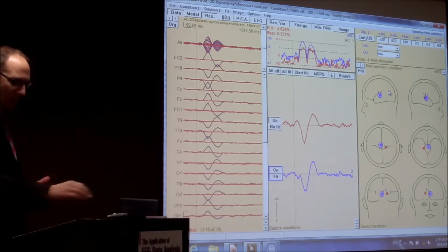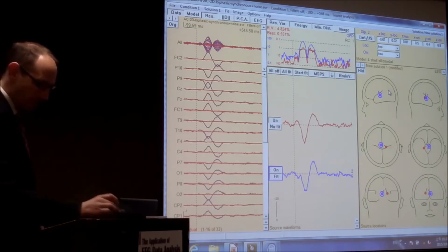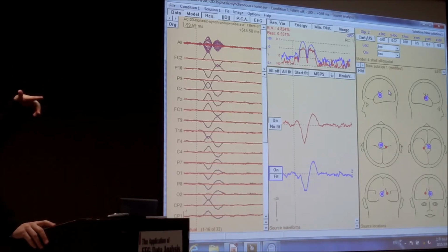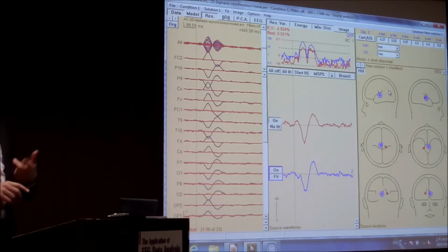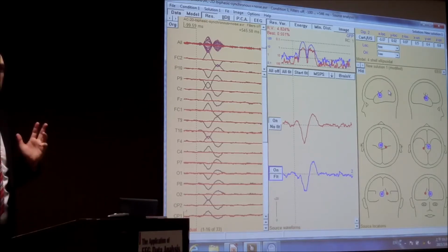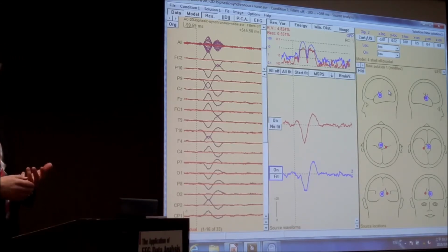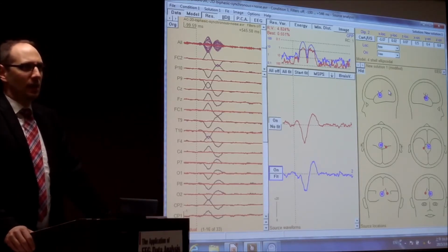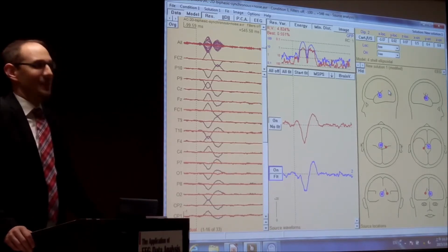So there is also no guideline where you can say you have to reach a certain amount of residual variance. You cannot say this because it depends on the quality of your data, it depends on your experiment, what to expect. So sometimes I'm asked, yes, I have to reach something like 90%, I think. I can say, well, that's impossible. That really depends on what you're looking at. Sometimes it's very good to have 50% left. But on the other hand, if it comes to seizure analysis, for example, you look at a seizure. During an epileptiform seizure, you have a lot of muscle activity, and that's difficult to get rid of. So you will have a lot of remaining unexplained signal.